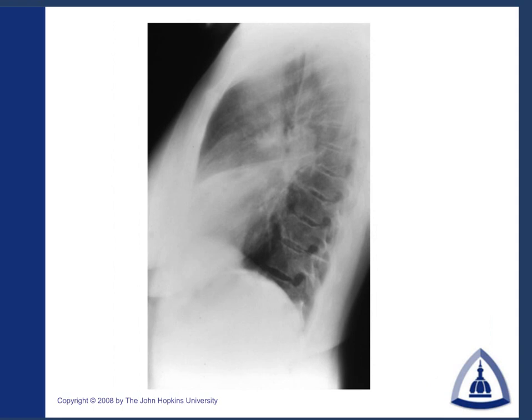When we look at the lateral, you can see this nice infiltrate here in the middle lobe. It's not complete atelectasis of the middle lobe because we do see some air going in, but at least one segment of the middle lobe is probably collapsed.